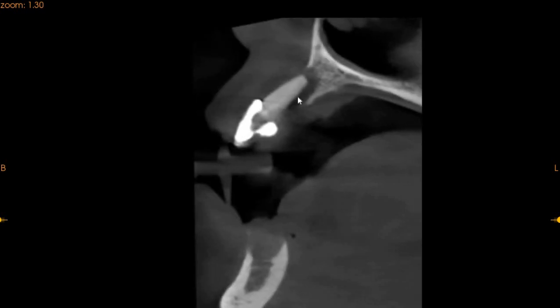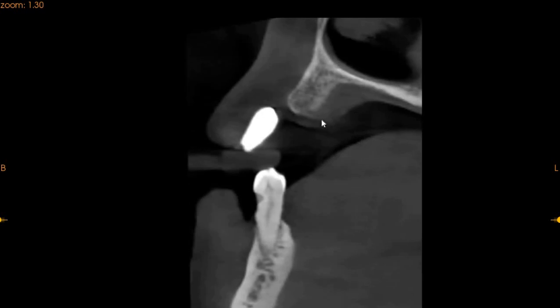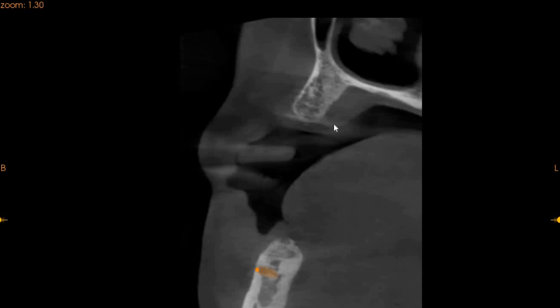Moving to the lateral incisor, it shows a significant periapical pathology. There is absolutely no buccal cortical plate, whereas the palatal bone also shows signs of resorption. The bone or the ridge underneath the canine appears to be very healthy, and implant placement can also be done in this region. Moving to the premolar on the top left quadrant, we've got healthy bone.